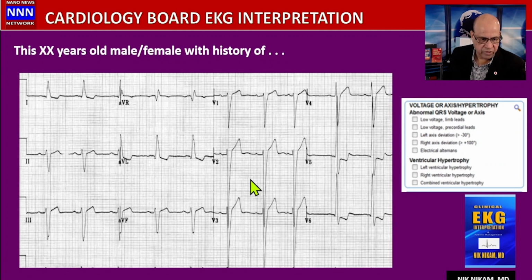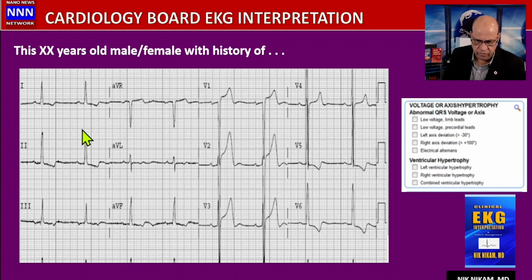And here's another thing I wanted to say. There's also intraventricular conduction delay. It's more than 90 milliseconds. It's almost like 110 milliseconds. So it's not quite characteristic of left bundle branch block, but there is an increase in that, called the intraventricular conduction delay. That's something.